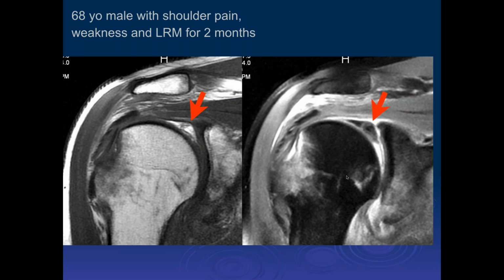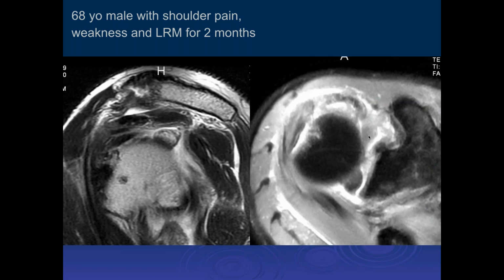Impaction fracture? Well, it's a little bit like a Hill-Sachs and a Bankart, except they're in a little bit different location. This is straight inferiorly, this is straight laterally, and then here we can see that fat in the joint space. That means that it's highly suspicious that you've got a fracture, and there's marrow fat that's extruding out into the joint space.